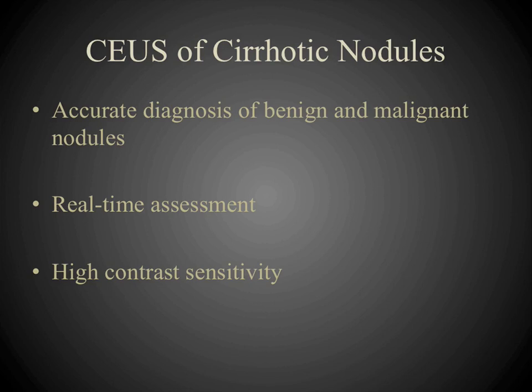CEUS can accurately diagnose benign and malignant nodules in a cirrhotic liver on the basis of real-time dynamic imaging and high contrast sensitivity. CEUS is appropriate for evaluation of nodules from surveillance, indeterminate following CT or MR scan, and for guidance and diagnosis in the post-treatment liver.